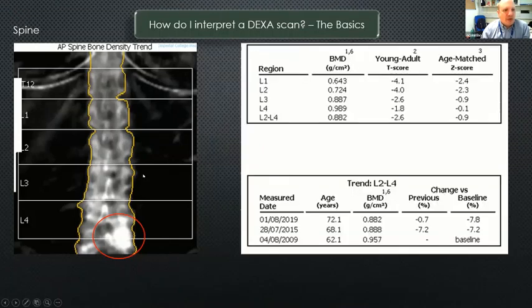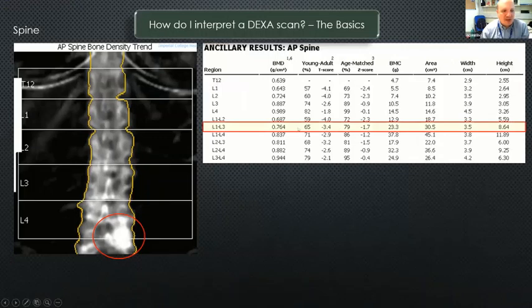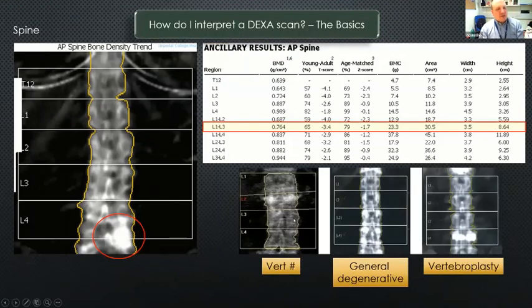Okay, so if we go back here, you can see the lumbar T-score on your report will say minus 2.6, but actually, more accurately, we should be using L1 to L3 and say that T-score is minus 3.4. This can make a big difference, especially if you're deciding on treatment options and if they fall under the NICE guidance, for example, for teriparatide. Okay, so the important thing here is to consider different forms of inaccuracy, especially in the vertebral films.